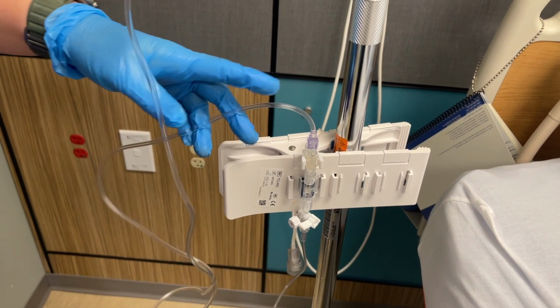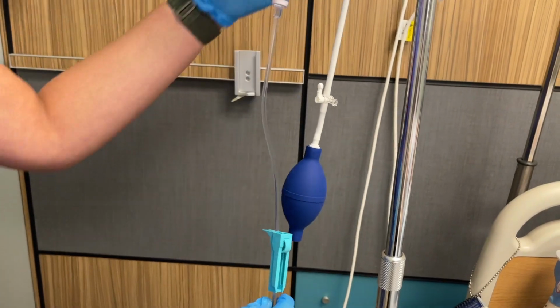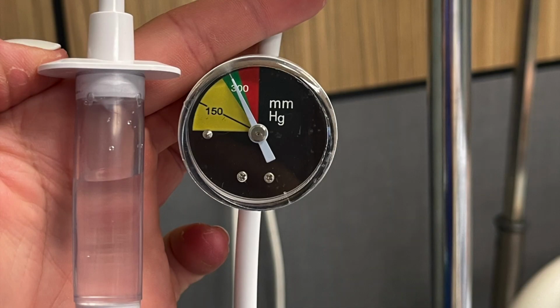The rigid high pressure tubing that we noted below the level of the transducer is not used above the level of the transducer. This follows a spike system with a roller clamp that spikes into a pressurized bag of 0.9% normal saline. Alternatively, these pressure bags can be called rapid infusion bags. For hemodynamic monitoring, such as IABP monitoring, we have to ensure that all of the pressurized fluids are always isotonic 0.9% sodium chloride. Each type of pressure bag will have some sort of dial or manometer so we can maintain adequate pressure. These are color-coded, and anything within the green area is good.